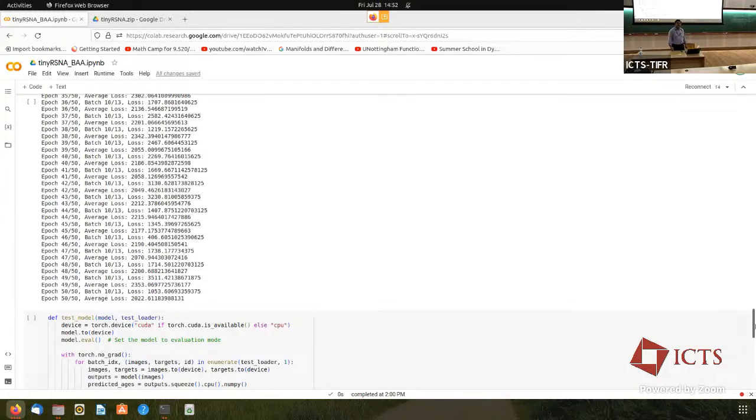For this exercise, actually 10 epochs was quite good. See, the loss keeps coming down, and after a while it tapers off. And then your gain in the loss is not that much. What you're looking for is the validation loss. The validation loss should come down, and then when it tapers off, you can't get any more gains. So 10 was actually quite good. After a point, the slight changes in the loss that started occurring didn't really add much.